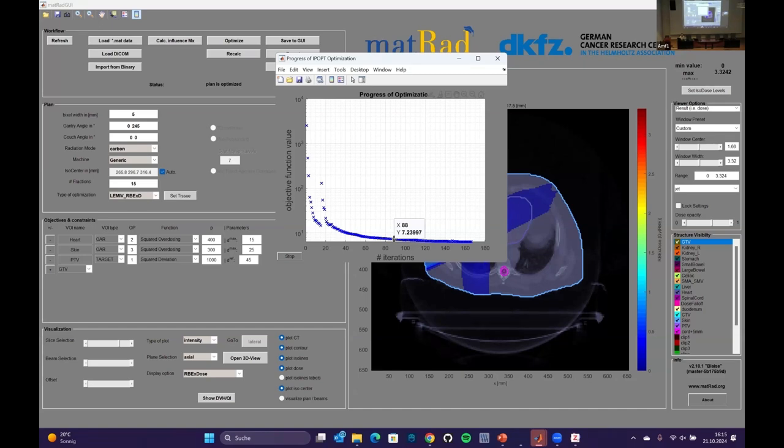And you can scale this to make the barrier very strong, so that it already pushes you away from the barrier when you are far above 0, or you make the barrier a little bit weaker, in the sense that it only gets active when you're very close to 0. And these spikes here are often cases of this barrier function changing, or getting rescaled.